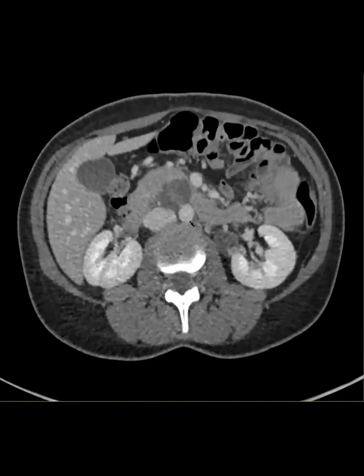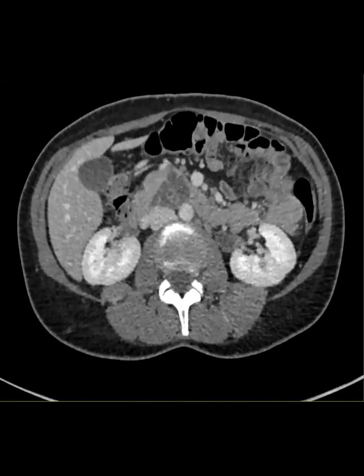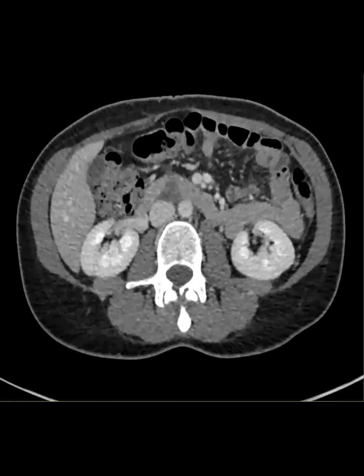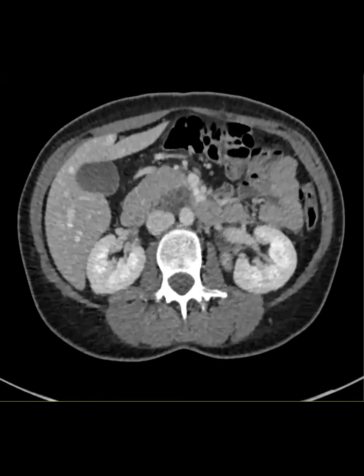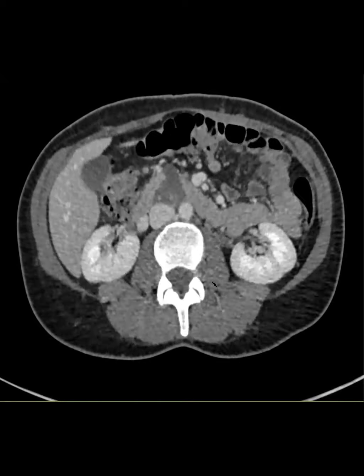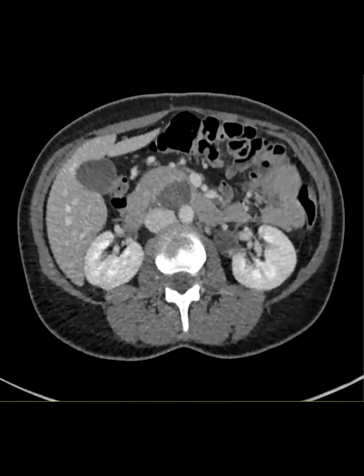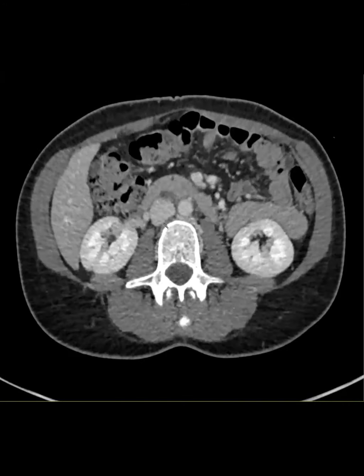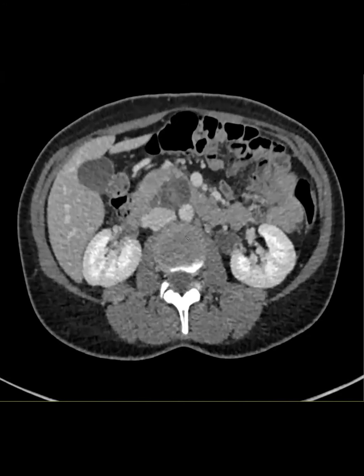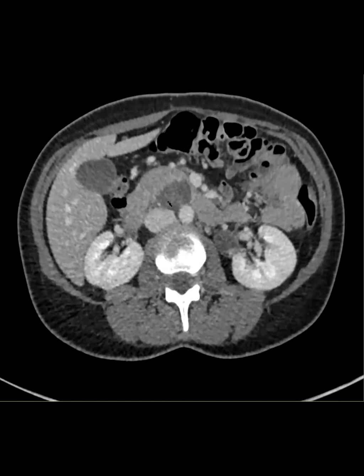I can show you, we have an MRI coming up, but what do you guys think about this lesion that is either arising from or abutting the uncinate process? Christine says lymphangioma, and Manjul says serous. Good. So that's exactly what we were thinking. Could this be a serous cystadenoma? Because it looks nice and lobulated and maybe has these enhancing septae that are becoming more confluent centrally. We didn't think it was an MCN. It looks too lobulated and not in the body or tail.